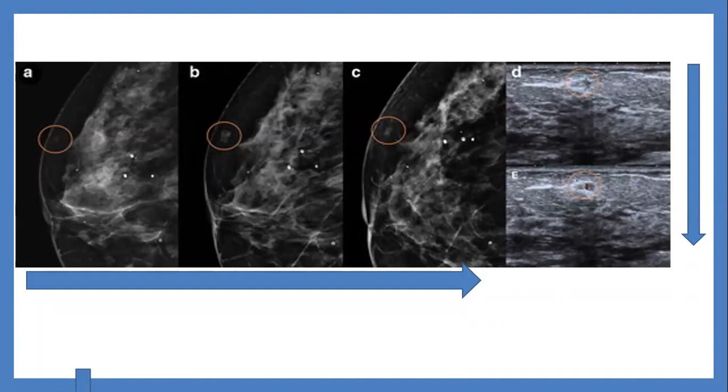So, keeping in mind the history of the patient, I will put this suspicious lymph node for biopsy. Being enlarged on interval without any change in characters in a patient having breast cancer is an indication for biopsy.